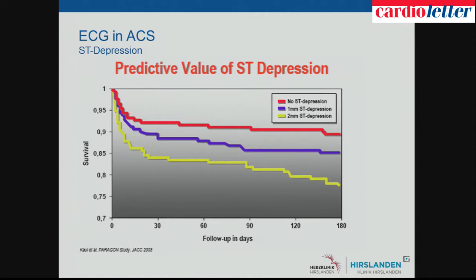ST depression, another classical sign. We know that the more pronounced the ST depression is, the worse the prognosis. And this is not only in the first 30 days, this is up to mid to long term. Data from the PARAGON study.